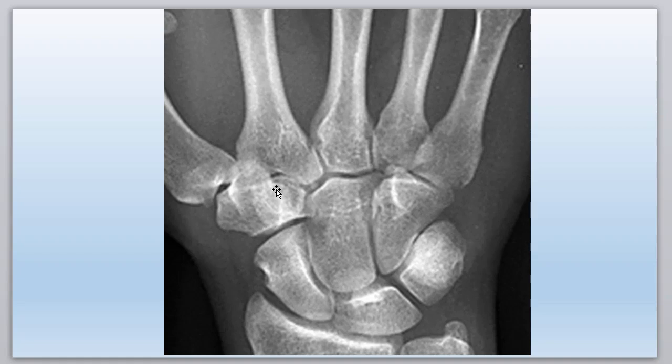You also see a big structure projecting out here. So here's the tubercle of the trapezium. That's important. That makes up the carpal tunnel, makes up the lateral border of it. There's a not so impressive tubercle of the scaphoid as well, but you can't see it quite as well, but it's right there.